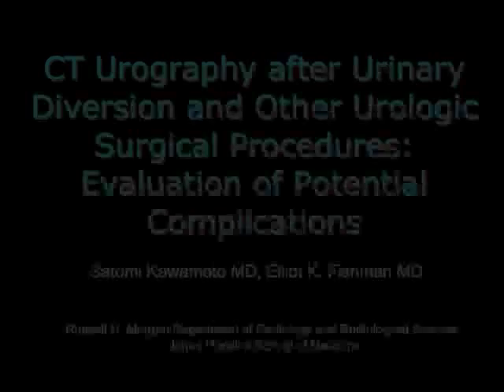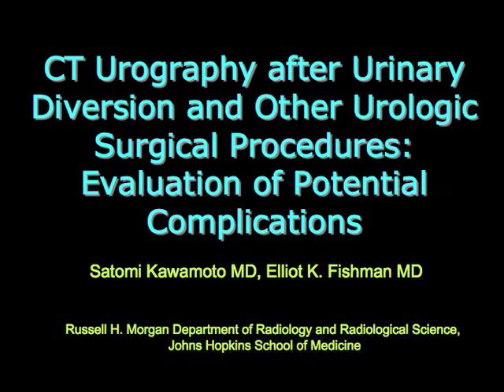Hi, this is Elliot Fishman, and this lecture will be on CT urography after urinary diversion and other surgical procedures, looking at some potential complications. And this is something we are doing a lot of with CT urography these days. We see a lot of surgical patients at Hopkins, whether it's prostate surgery or bladder surgery.